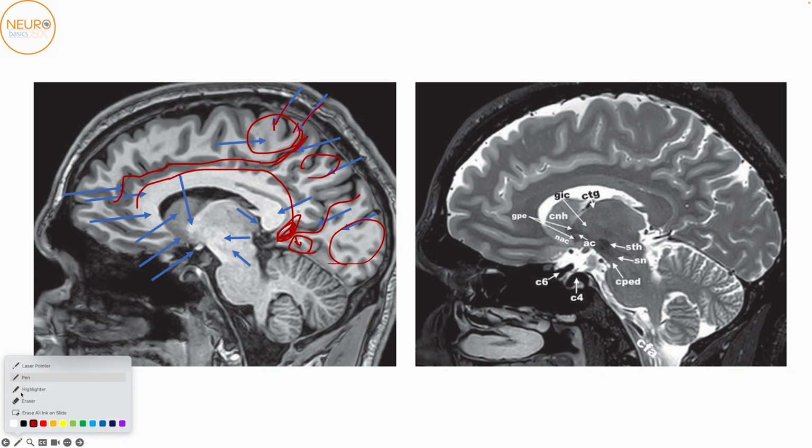Okay, so you have the calcarine sulcus. Above that you have the isthmus, and below that is the lingual gyrus. You have seen the splenium. This other structure arising from the corpus callosum and running into the lateral ventricle is your fornix over here. This here is the pulvinar of the thalamus. Okay. This here is the caudate nucleus that we had seen previously. That is still a little bit part of the lateral ventricle floor.